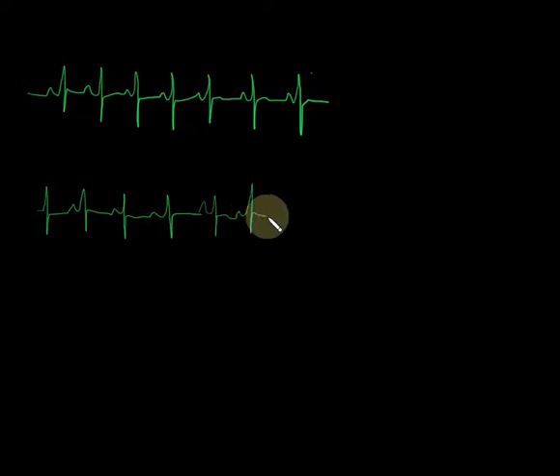and it's going to be a little sloppy because I'm drawing on this, but let's just say for a second here that that didn't happen. Now we've got P waves here, but now I've got an extra P wave, and it gets clipped off at the end. Well, I would expect there would be a QRS here, but I can't see it. So you can't judge that there's not a QRS when you can't actually see what happens.